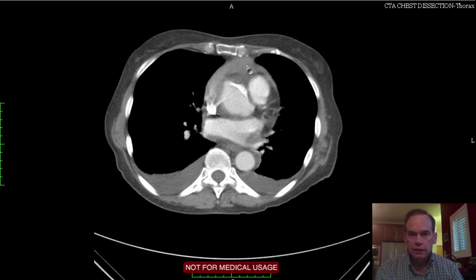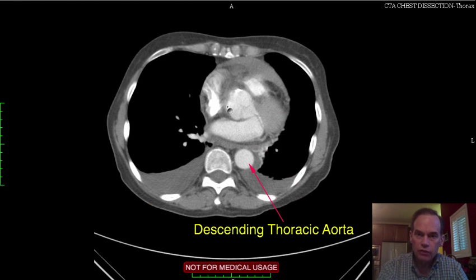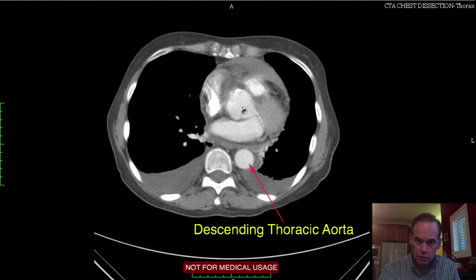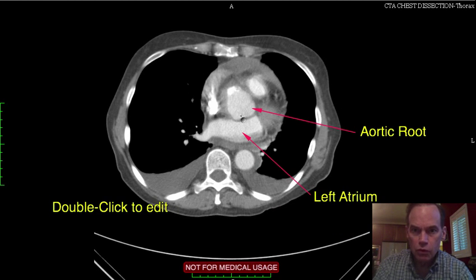Okay, here you have the aortic valve, and you can see the three leaflets, kind of. A little bit here you can see there are three leaflets coming from the central aspect. It may look more like two there, but here's 1, 2, 3. Go up a little higher and then we lose it, and it becomes the aorta with the mural hematoma.